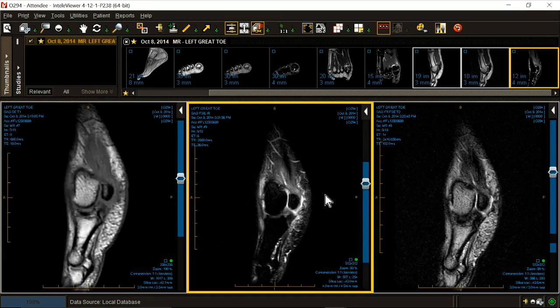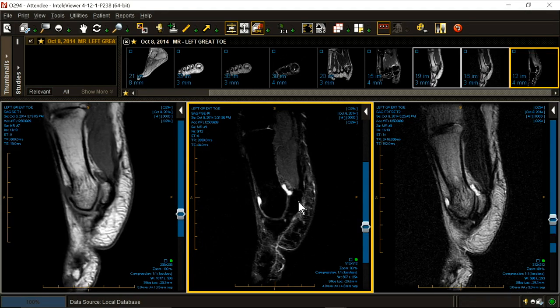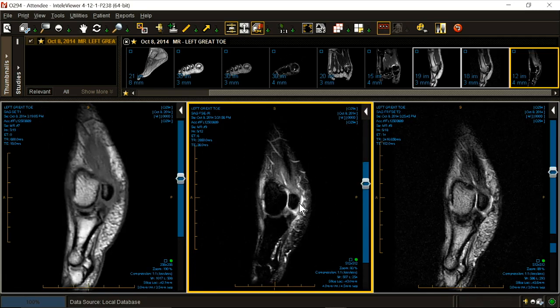All right, let's scroll. Medial sesamoid, not fractured. Let's go through our checklist. Lateral sesamoid, not fractured. While we're here, fibular head of the flexor hallucis brevis, intact. Let's go back to the medial side.